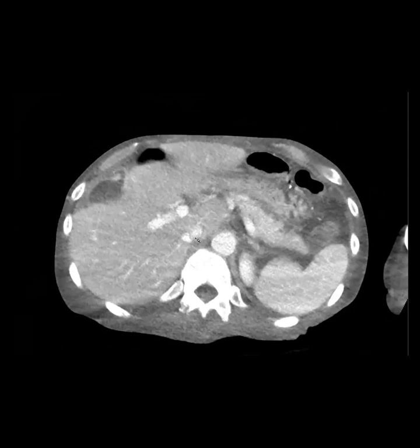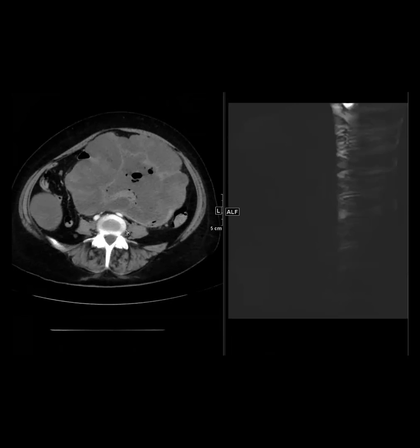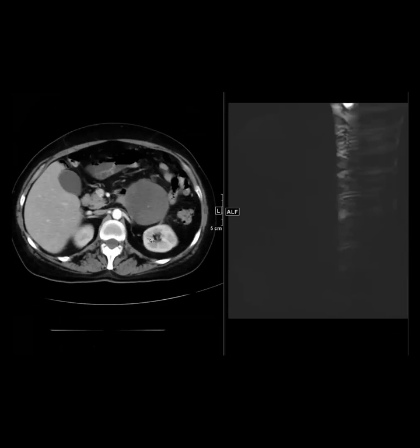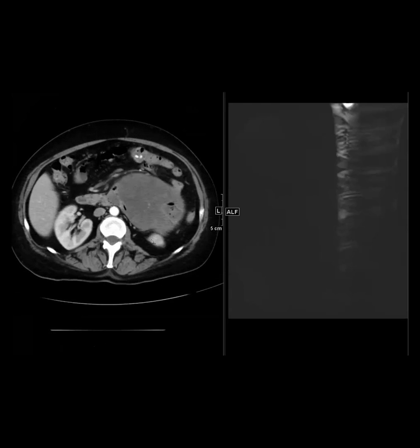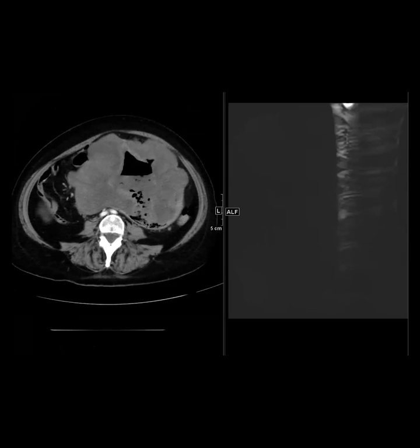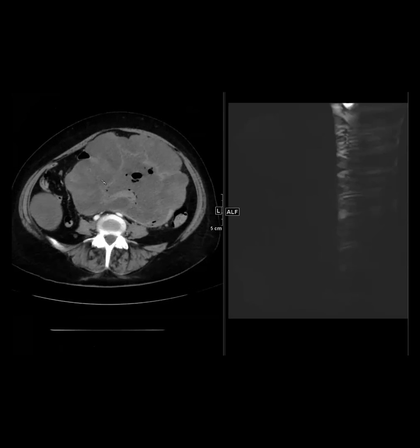Yeah, definitely. Great. My next case is this one. This patient had this large mass in their abdomen. Maybe I'll keep it this size. You can see it almost looks like it's communicating with a bowel loop. It has a lot of central air and fluid with a thick rind here.